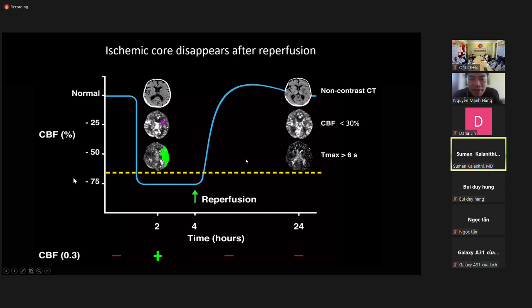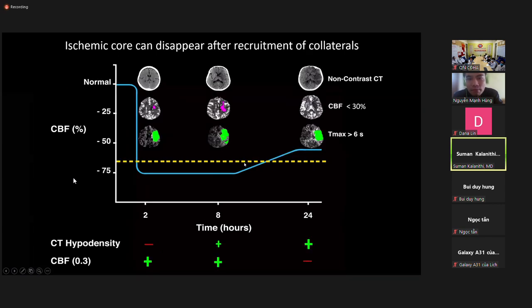Okay. Then another example that's a little more tricky is, here's a patient who, again, is very similar, but their clot was never pulled, and you see they're getting worse and worse and worse. And then at hour 24, they have this big delay, it's still there. They have a huge stroke here. But then again, you see CBF less than 30% is normal. And then you say, what? This is ridiculous because RAPID is not working.